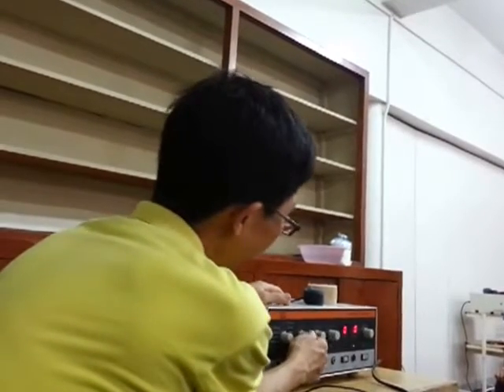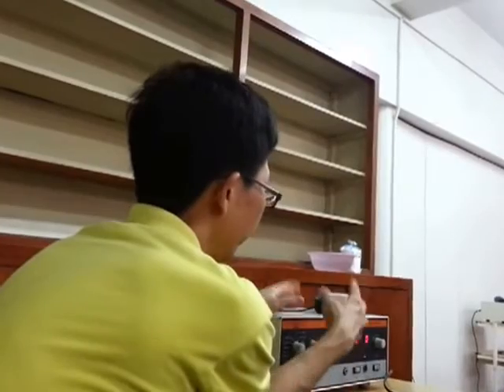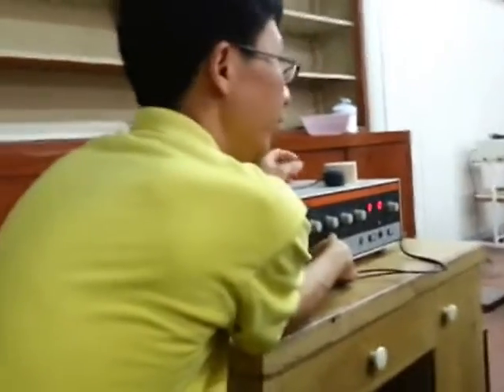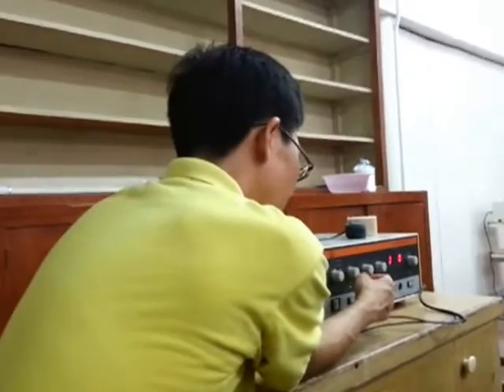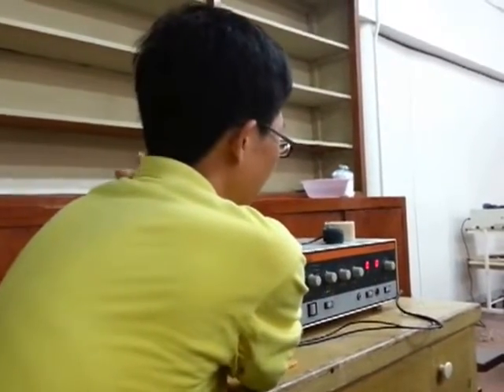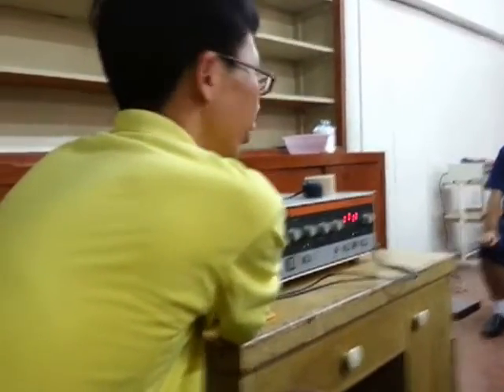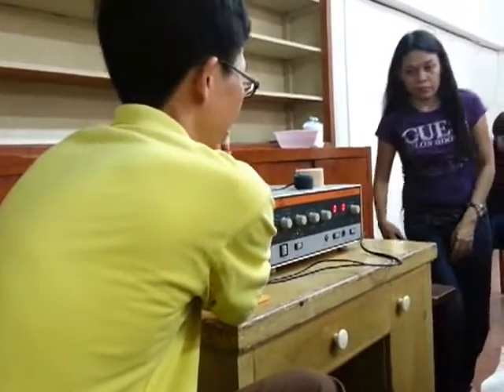Okay, next, this one. This would be your pulse duration. When you say pulse duration, it is the duration when it gives out current. Unit is in terms of milliseconds. So here, if the muscle is innervated, then you can use a very minimal pulse duration up to a very high pulse duration.